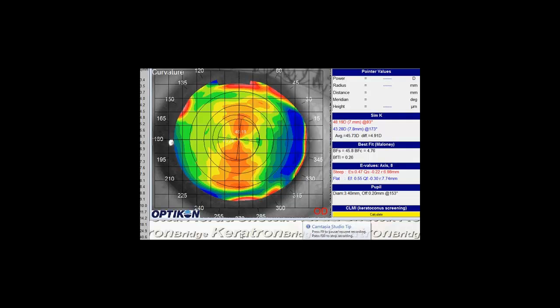Okay, as we run through these 7 steps, we'll use this cornea as the initial example to design a lens, and then when we're done, we'll run through a few others just to show all in one so we can quickly design some lenses. So the first step is choosing the diameter.